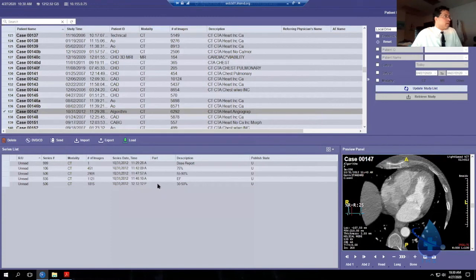All right. Now, you don't read on this little slice, this little baby window. Let me stop and see if anybody has any questions. We've discussed just the buttonology on this screen, the buttonology here of series, the baby window, gating relative to the cardiac cycle. Here's how you open it.